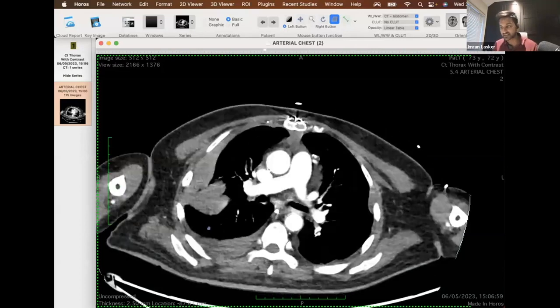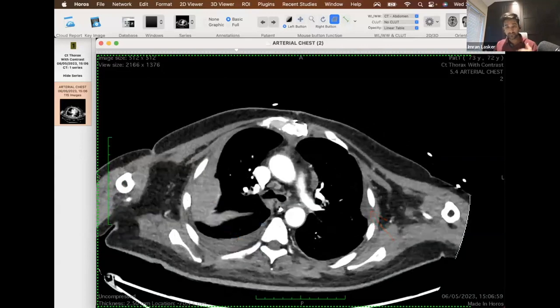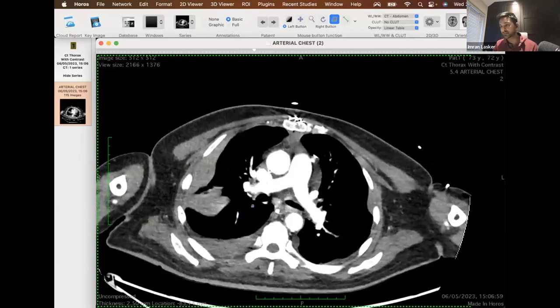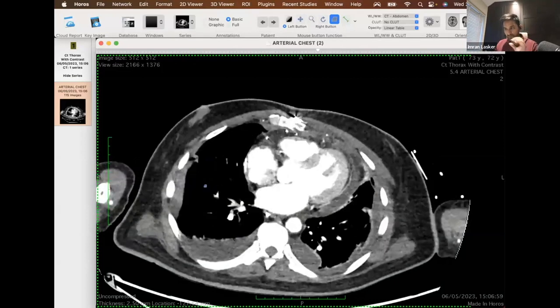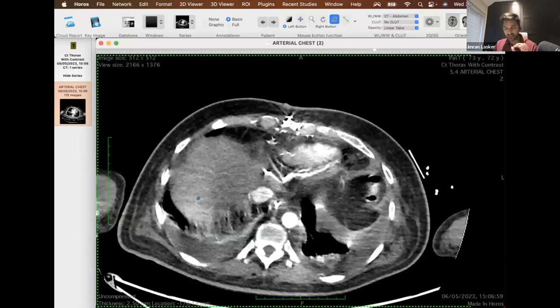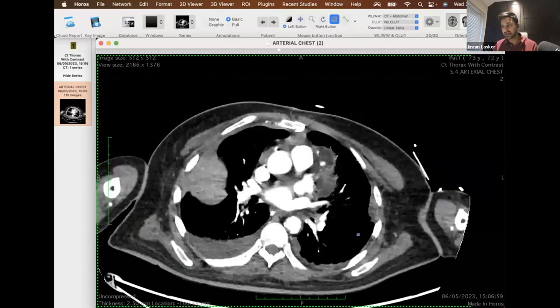So I thought this is an interesting case because it illustrates quite well how at first glance, when you go through it, you think, pleural effusion, cardiogenic failure, big deal. But actually, when you look at it a bit closer, you can see, yeah, you know what, there is a difference between that density there and that density there. And that's where you've got to start being worried. Now, the big question is going to be, is this patient still bleeding? So you've got to scroll through and really try and make sure that you can't see any sort of bright blush located within that pleural area. Because if there's that bright blush, then you're thinking that, okay, this could be an acute and ongoing bleed. But I don't think I can convincingly see that there is anything like that.